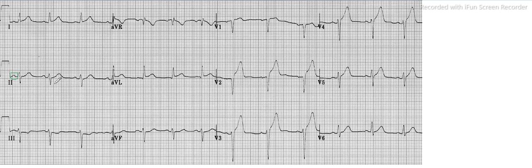If we go to find the rate, first of all we need to find out whether this is a regular or irregular rhythm. So you see here, 1 2 3, almost 3.5. So let's see, 1 2 3.